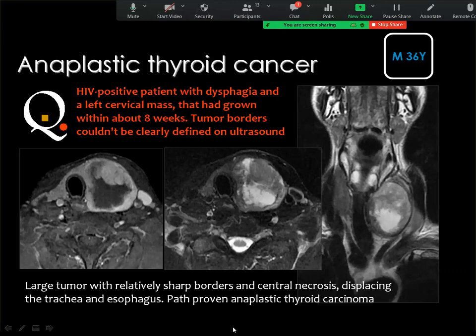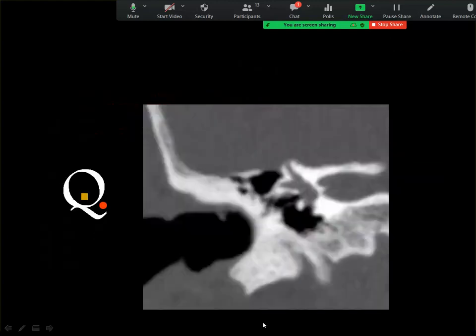of thyroid carcinoma, but sometimes you can spot this from the films based on the tumor being big and there is a good part of the tumor that is necrotic. And based on these findings, you may diagnose the possibility of anaplastic type of thyroid carcinoma.